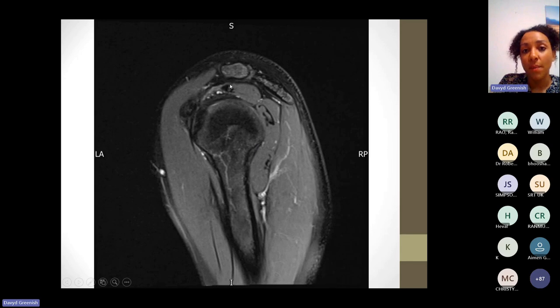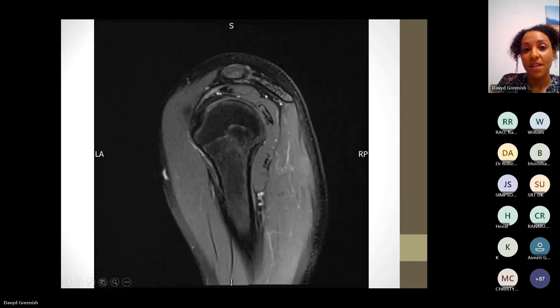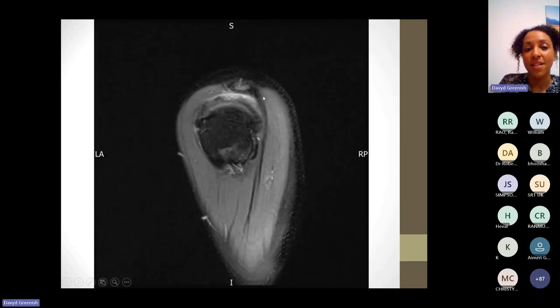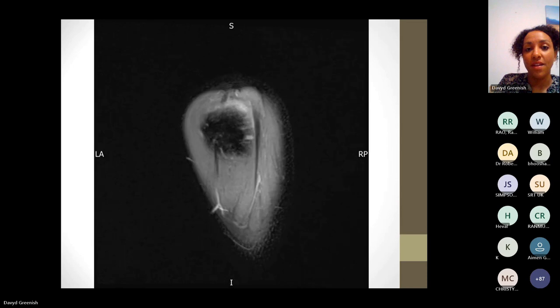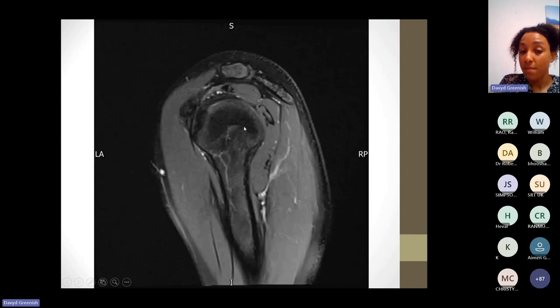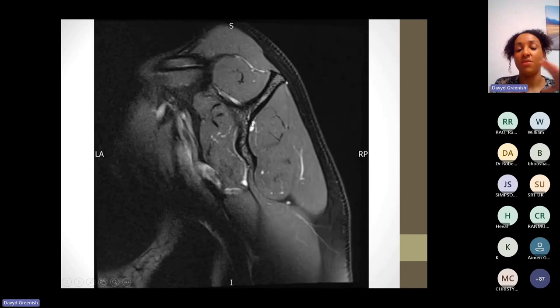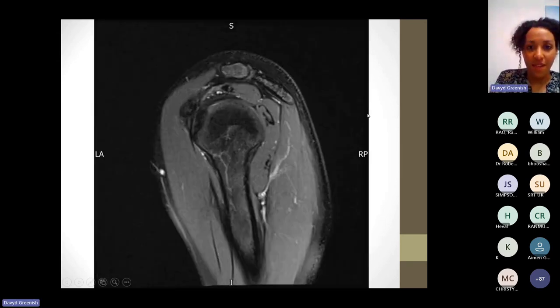And these muscles, their tendons, are now becoming more obvious. Tendons coming in. And there they are, just inserting on the humeral head. It's slightly tricky to see here, but they will be inserting on that humeral head there. So if you didn't believe me before, that's the sagittal plane. You can see those rotator cuff muscles and how they relate to the humerus. Okay.